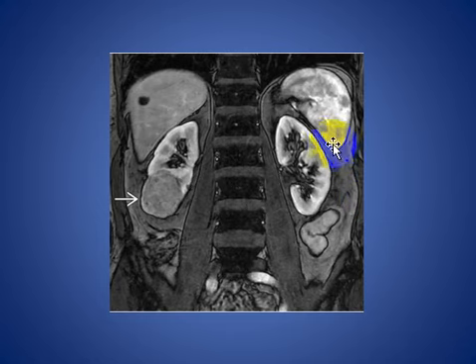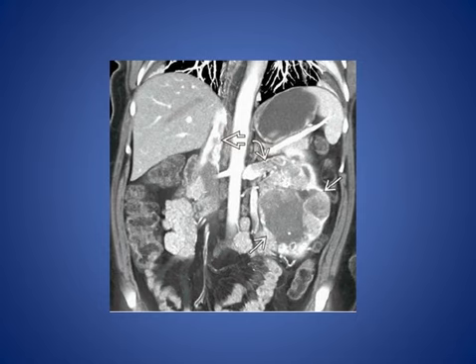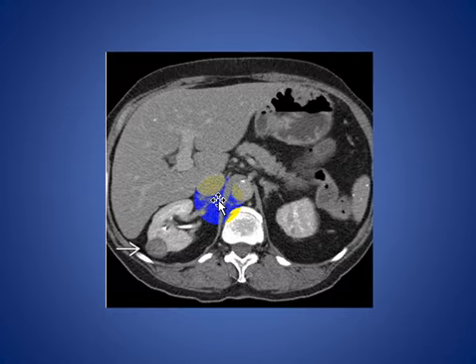Here, this is renal cell carcinoma, T1 weighted imaging after contrast involving the right lower pole of the kidney, incidentally discovered, and renal cell carcinoma was confirmed at nephrectomy. Here another patient with a large tumor involving the left kidney, two-thirds lower pole with invasion of the renal vein and extended to the IVC. Here another patient with renal cell carcinoma, exophytic type.